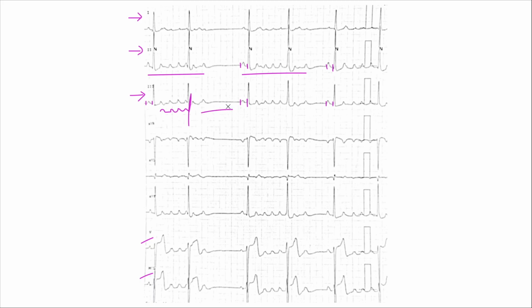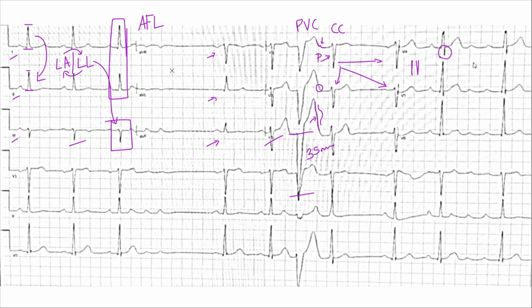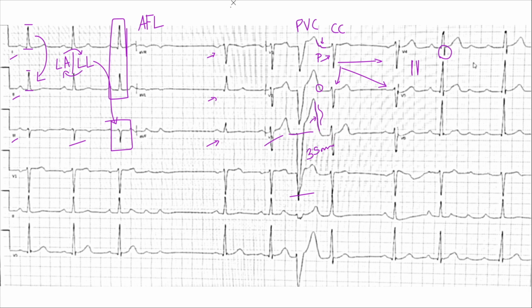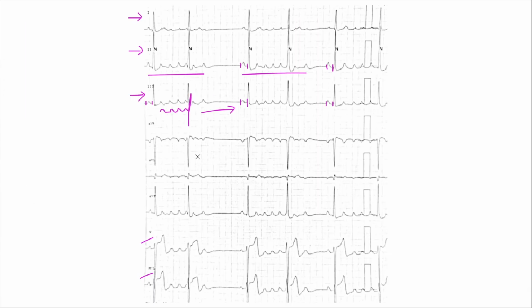We do have exit pauses, right? And by the way, these are two different times, right? This is not the same ECG, this is on a different machine. This happened a couple hours before this one. All right. Now, AVR is inverted. It is huge. Lead 2 is huge. AVF is huge. Let's see here. AVL is isoelectric. So there's something going on with this patient.